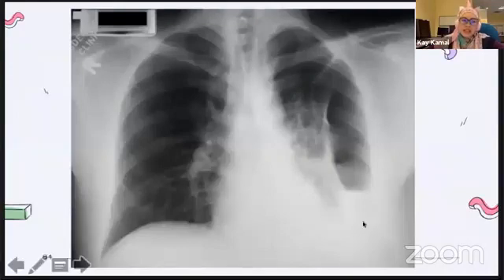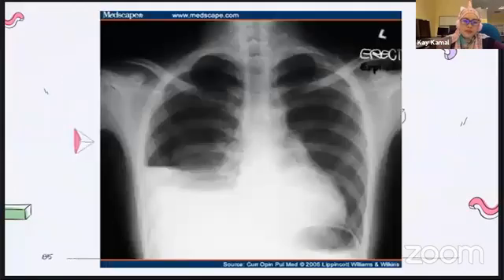And in this case, when you see a pneumothorax, but suddenly there's an air fluid level inside, so it could be a hemopneumothorax or a pleural effusion plus pneumothorax, because there's an air fluid level. It's not supposed to be any air fluid level if it's just a pneumothorax. And this is another example, pneumothorax with air fluid level. You see that there's air, and suddenly there's an air fluid level here.